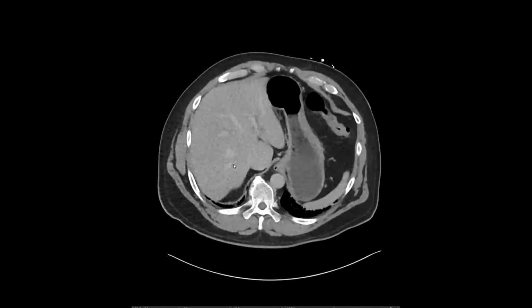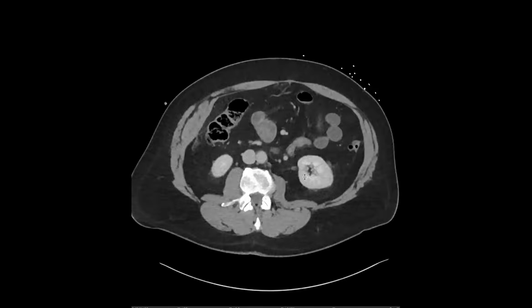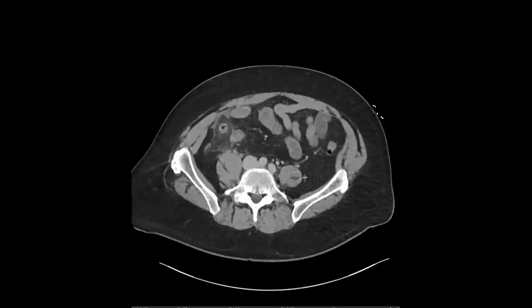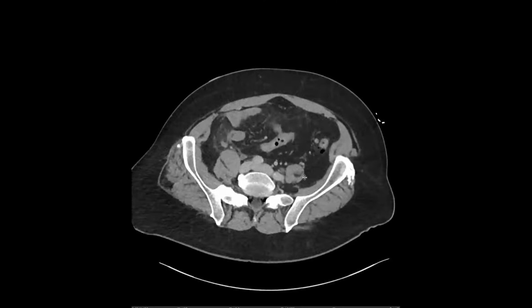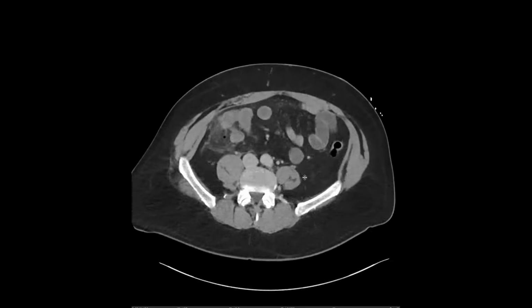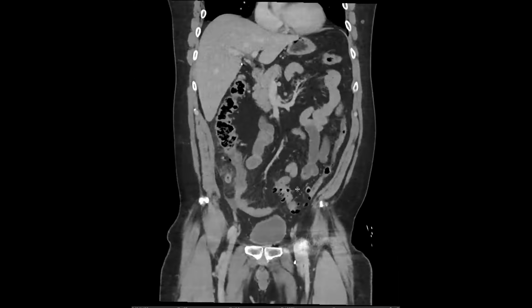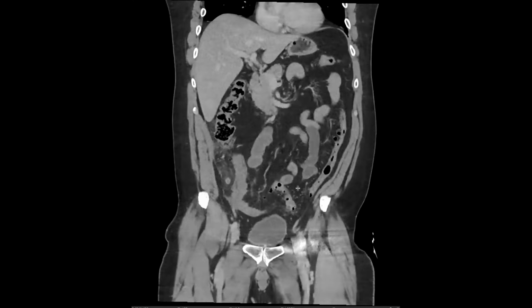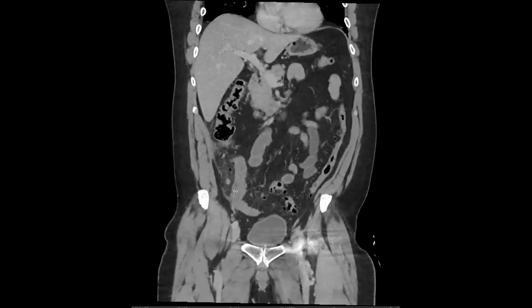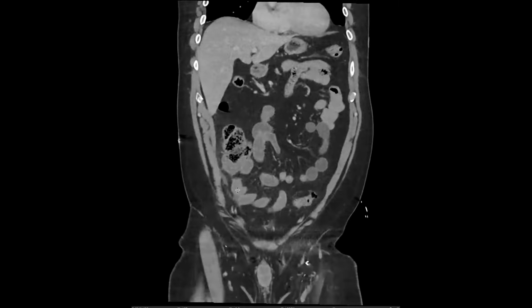This is the patient who came with abdominal pain through the emergency department. I'm seeing inflammation in the region of the appendix. Yeah, that structure is the appendix. So here's the appendix here, with fecalization proximally, stranding around it, and secondary thickening of the cecal base and terminal ileum.